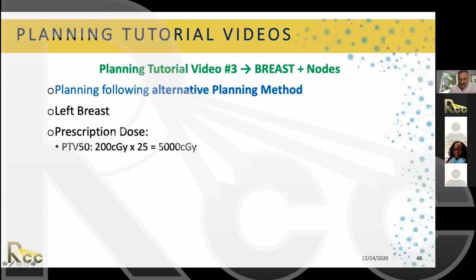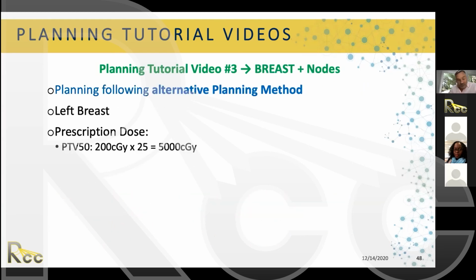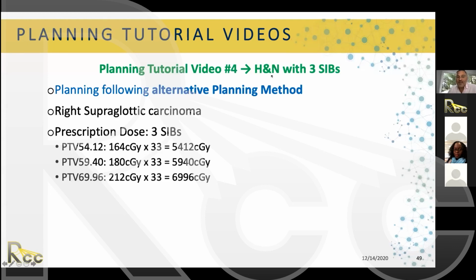So for the planning challenge, you're going to be using these 2 cases, and you're going to be using the VMAT planning guidelines that we explained in these 2 topics. As an extra for your own materials and enjoyment of watching, we have these other 3 new videos. One is for a breast case. It's a left breast carcinoma with 1 dose level. It's breast and nodes going to 200 centigray times 25 fractions. Then we have the same head and neck case that you're going to watch in video number 2. We did it with the alternative planning method with the 3 dose levels.